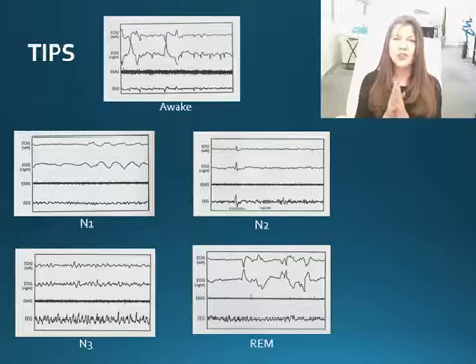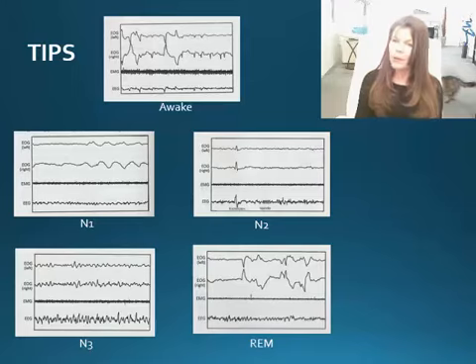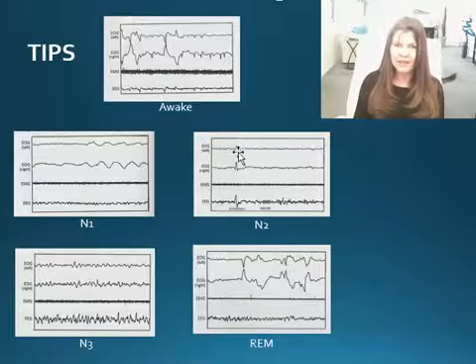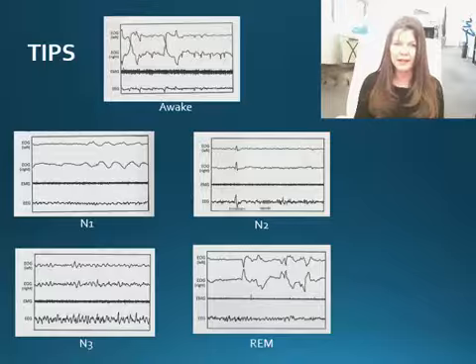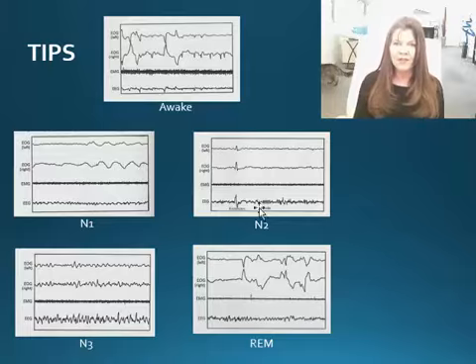Now stage two. A lot is happening here. It's a really interesting stage. Notice no eye activity. What we see here is not a blink. Okay, so let me see if I can get this on my cursor right there. What you see there is not a blink because it is not symmetrical. So it's just a reaction from the K complex in the EEG below. So notice this great big K complex going on here in the EEG.